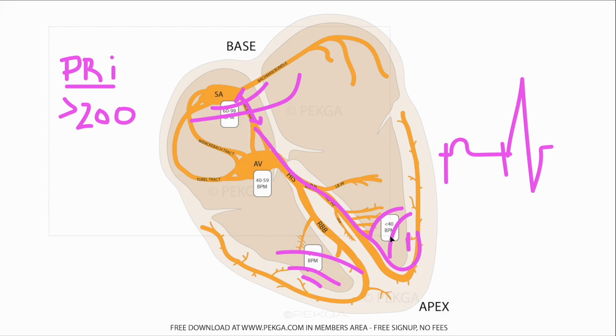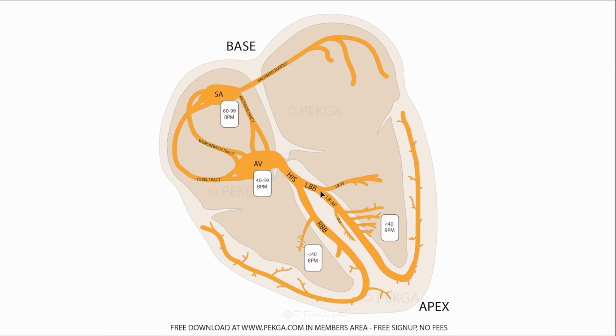Typically, everything is typically. Let me be precise here. From this point on, roughly, to the point where that signal reaches the ventricular myocardium, this is not visible on the ECG. It just kind of gets negated. One signal interferes with the other and you just don't see it.